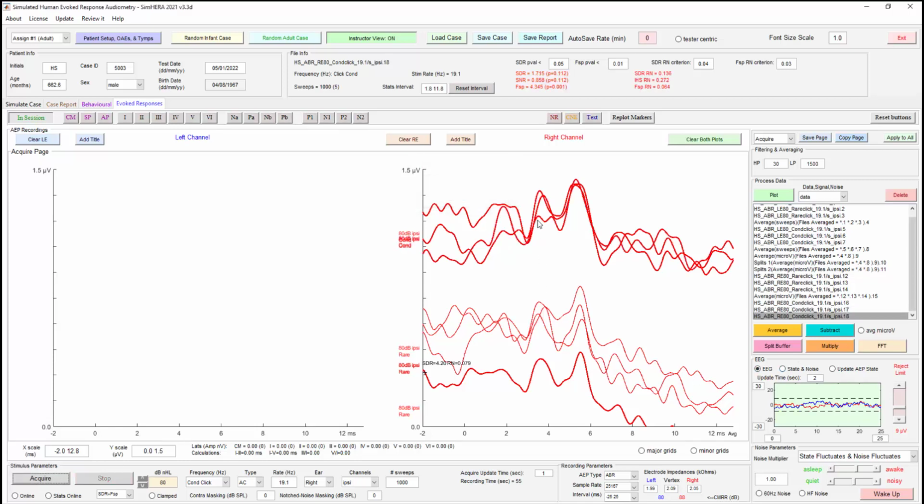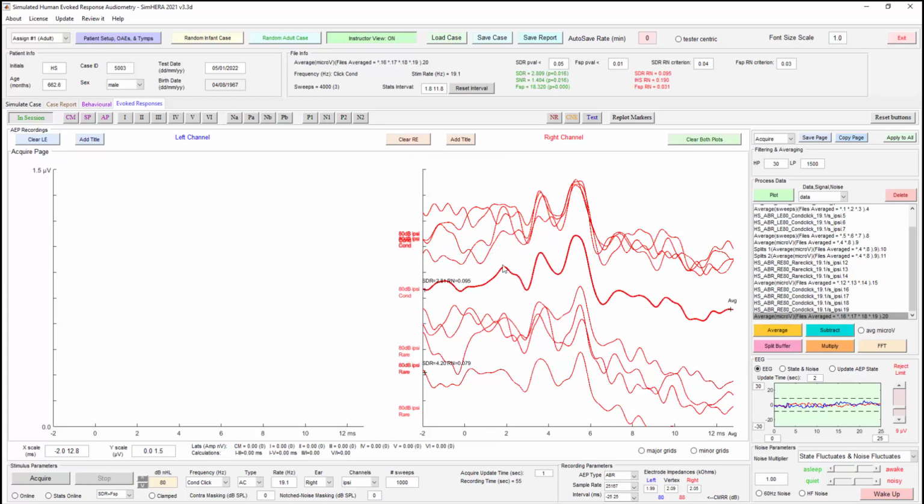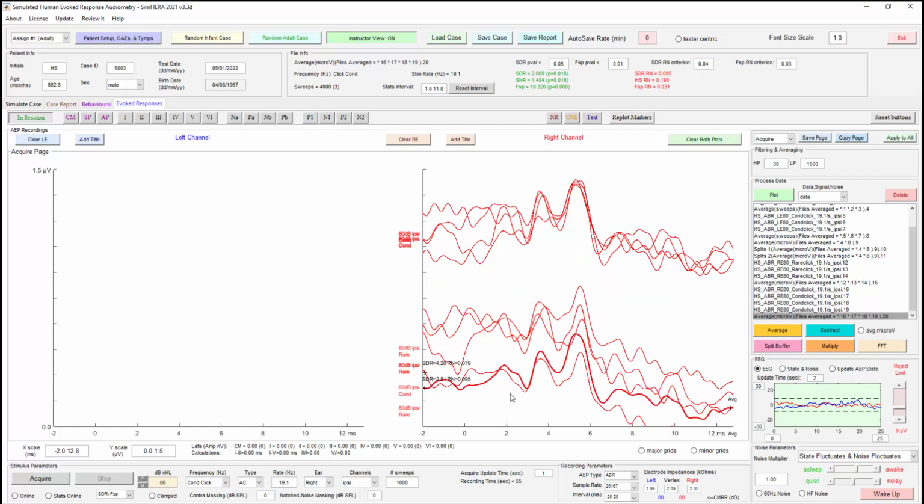We'll need another recording. Wow. That's not really replicating too well for wave 1. Let's see if the average is looking a little bit better, but it's kind of hard to distinguish whether or not that's wave 1. It's looking that way, and yeah, when you overlay these two, there we go, there's wave 1. That's probably a wave 2 shoulder and wave 3, and then a 4-5 together.